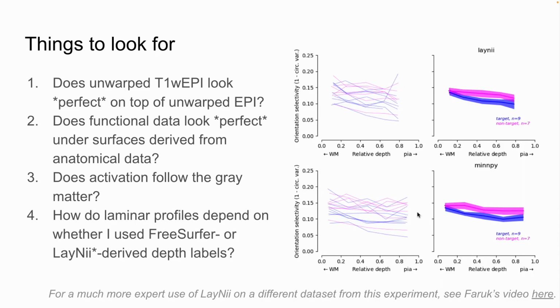So at the end of the day, you pick your region of interest, you think you don't have any problems there, you pull out your depth labels and you pull out your statistic representing what happened. What I'm showing here is even more complicated than that. This was an orientation tuning experiment. The participants saw 8 different orientations, and so every single voxel gets an orientation tuning curve fit to the response of that voxel to the orientations. We were seeing if at 0.6 millimeters we could get small enough to actually detect orientation columns, which are a canonical structure in human visual cortex. The answer is no.